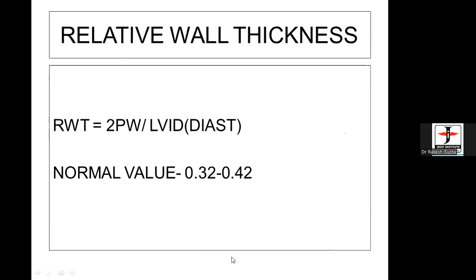If you look at the American Society of Echo, they say 10 millimeter or more is considered hypertrophic. So we said in our lectures 12 millimeter. When we talk of hypertrophic cardiomyopathy, we say 15 millimeter. Similarly, if I'm looking at the sibling of hypertrophic cardiomyopathy, I'm talking of 13 millimeter. Sir, we as beginners do some mistakes in measurement. 12 millimeter or more in hypertensive heart diseases.